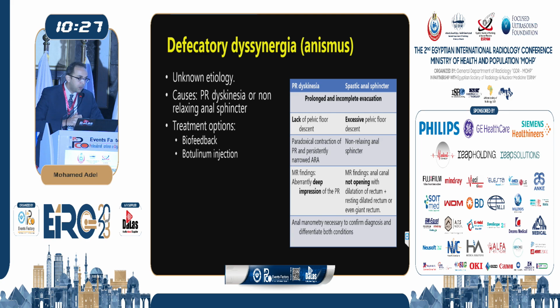Treatment options can include biofeedback and training, which is basically potty training, and botulinum injection. Sometimes it can also result in surgery. The most important thing on imaging is the prolonged incomplete evacuation of the rectal gel. This is the most sensitive way to diagnose this case. It's not about seeing a muscle or an anal canal that's not opening. It's just that the patient would clearly be straining on MRI and trying to evacuate, and yet he can't.